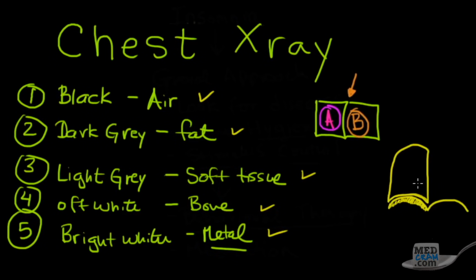Now, if something were to happen in that lung, let's say there were a pneumonia, that pneumonia in that area is going to turn this air-dense lung into a water-dense lung. And so therefore, this demarcating line is going to disappear, and you're not going to see it on the x-ray. And so if you lose that line, you can say then that there is no demarcation there between the different densities. So you would call that a right lower lobe pneumonia.